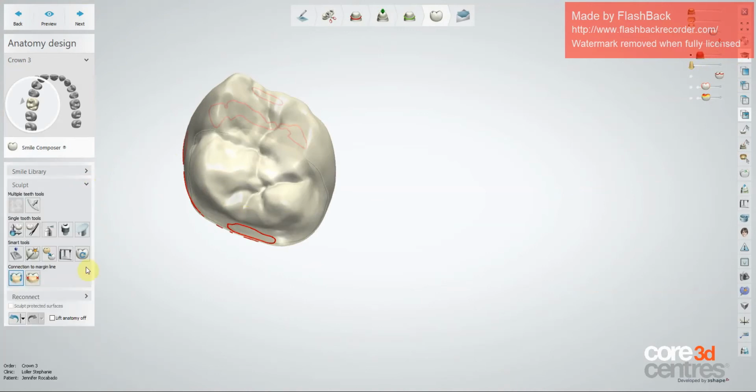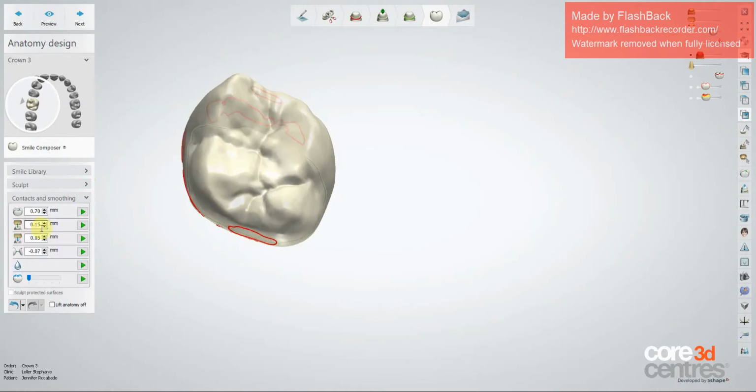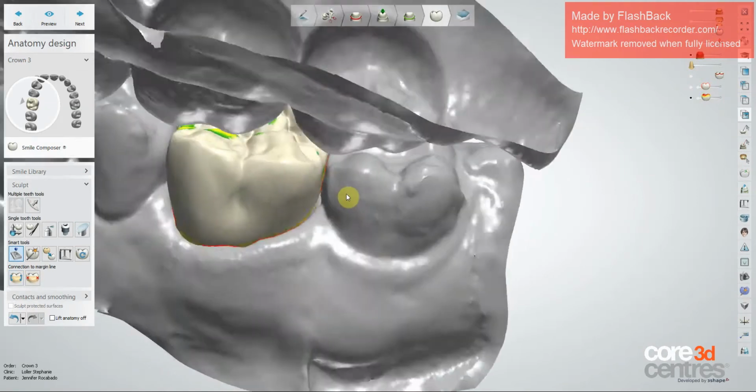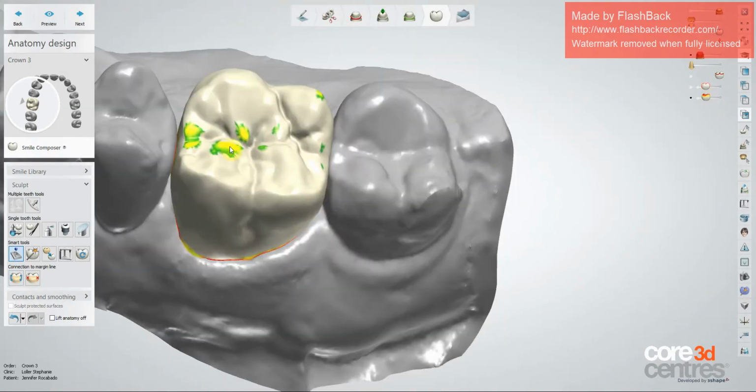Let's go back, do it real quick. Show you Z. Okay, I'm going to do my occlusal clearance, boom, contact, boom, and then I do my margin line, or connect the margins, and I turn this on. Make sure this is on, and put this about 0.34. The distance map just gives me a color reference.